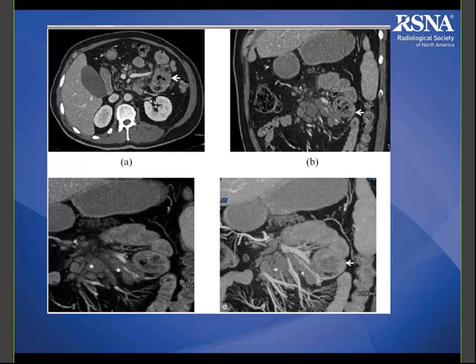And here we see a lot of mesenteric adenopathy and this focally dilated bowel loop with some suspicion for wall thickening. And this was lymphoma. With the lymphadenopathy, there's the classic sandwich sign, if you read about that or teach that to your residents in training: all the mesenteric lymphadenopathy encasing but not obstructing the mesenteric vessels, very classic for lymphoma.